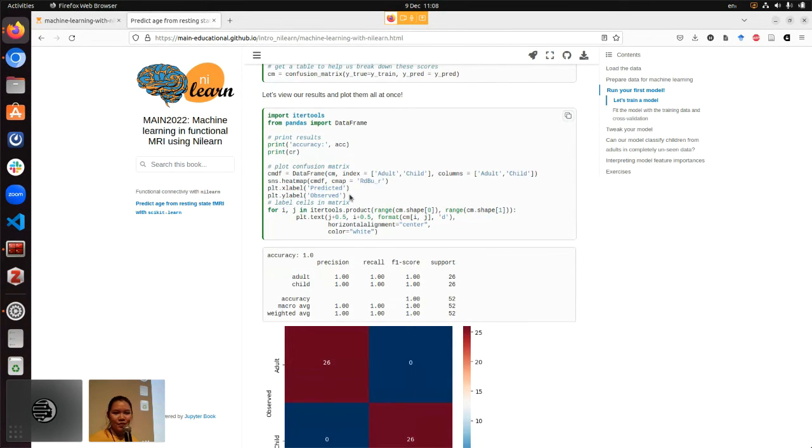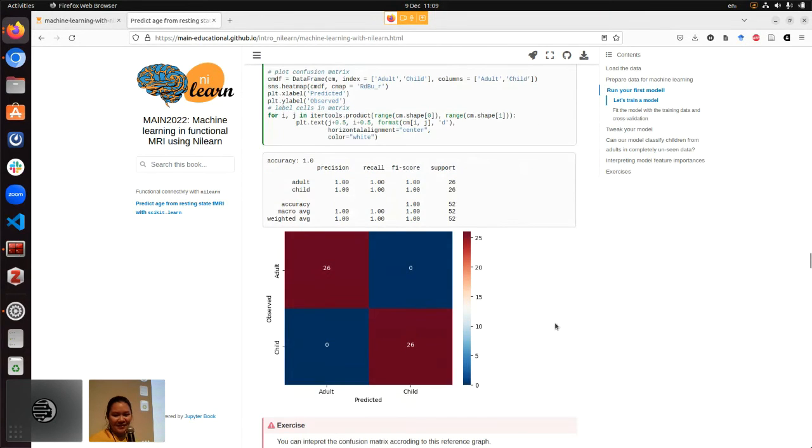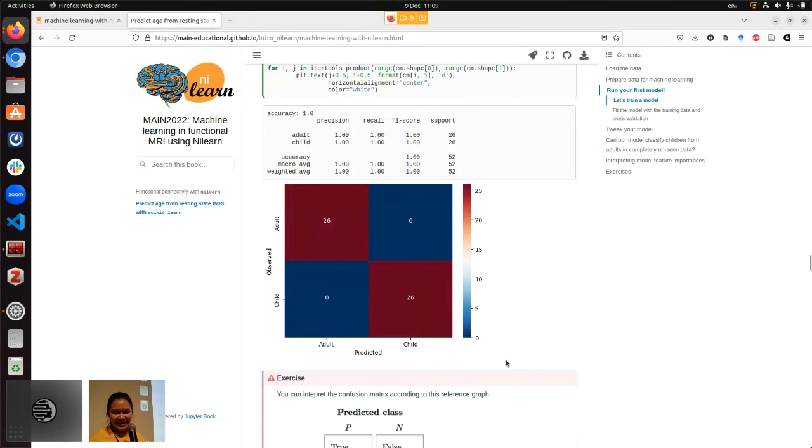And we found something. So we can plot the accuracy. The accuracy is 1.0. It is a perfect classification. And for the confusion matrix, we can also see you're perfectly predicting adult as adult and child as child. Is this good news? No, I see a lot of people shaking their heads in the audience. I'm really glad your intuition is so good.